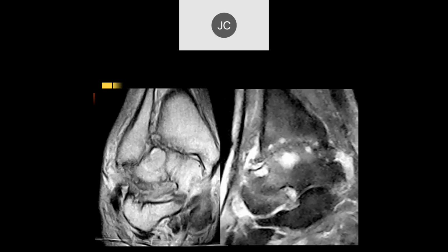All right, it's a low field scanner. Looks like severe cartilage loss in the joint space, narrowing of the tibio-talar joint, extensive subchondral cyst. It looks like bone-on-bone articulation. And here you notice there's a lot of remodeling. The tibial plafond should go straight across here. Here it's being worn down, it's remodeled.